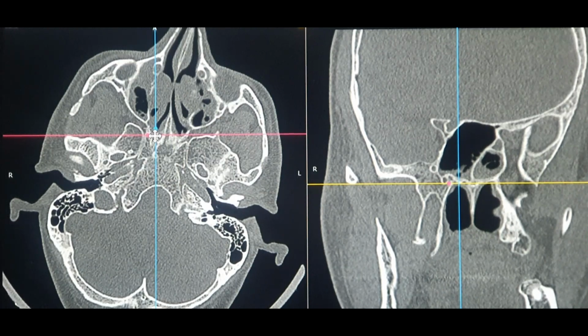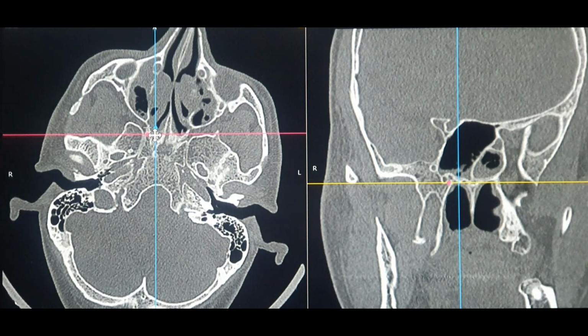So welcome back guys. Today in this video I'll be talking about the detailed study of the axial section of the CT scan PNS. As you must have seen in my previous videos, I've spoken a lot about the coronal section, how you can read a CT scan, the basics for the residents, for the ENT surgeons, for seniors as well, and for the radiologists as well, what exactly is expected from a radiologist, and how you can read the CT PNS before a surgery. So today I'm going to talk about the axial section.